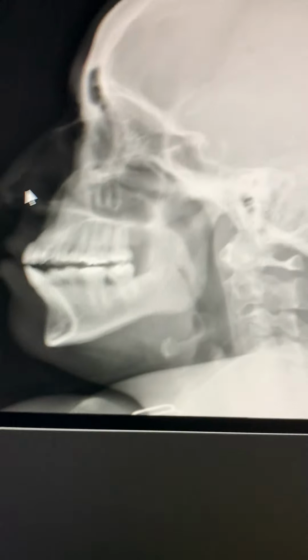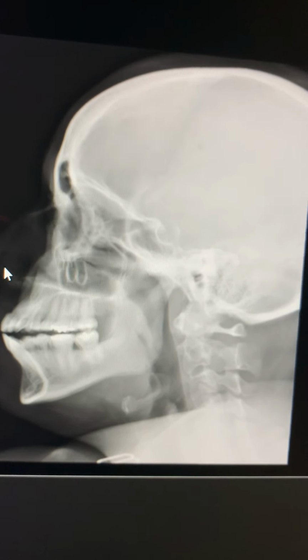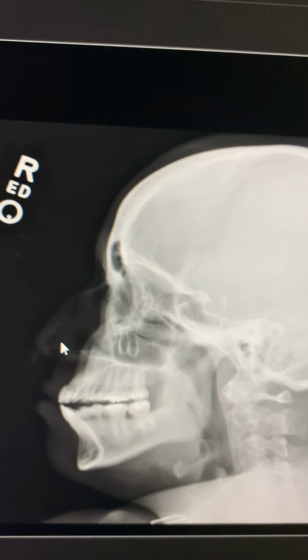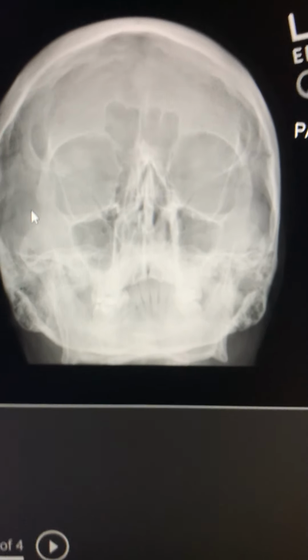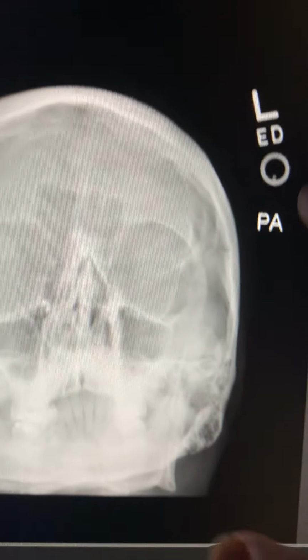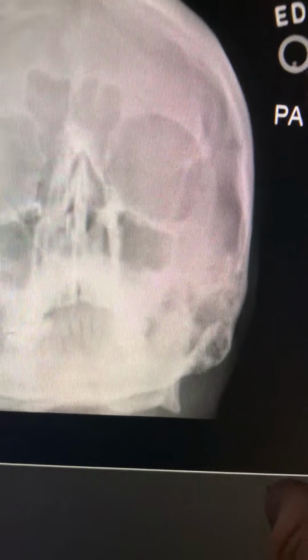And in any other place that would not require such open collimation, 6x6 or maybe a 5x5, we could all fit all the sinuses, since it does keep them all in profile. And here we have our PA Waters view. This was marked PA, annotated PA, left marker to demonstrate the left side.